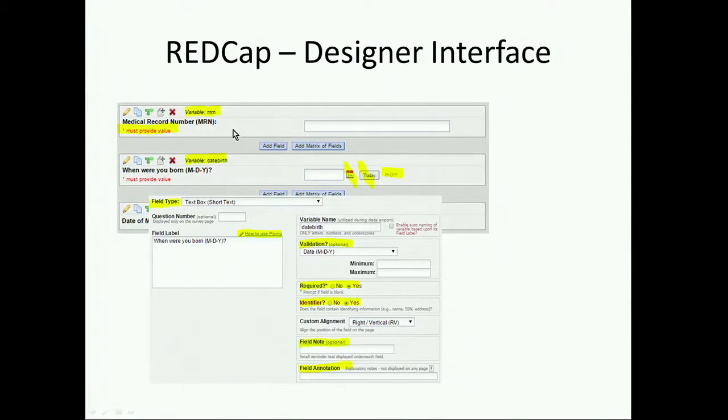And so, as an example of the way that the layout works when you're creating variables, they have a designer that starts very simple and then becomes more and more complicated as you dig into it.